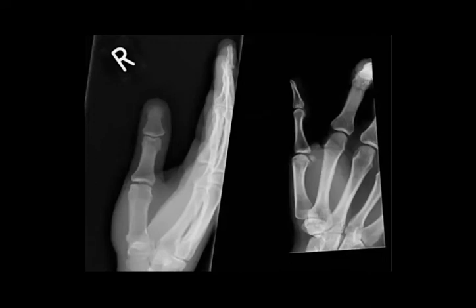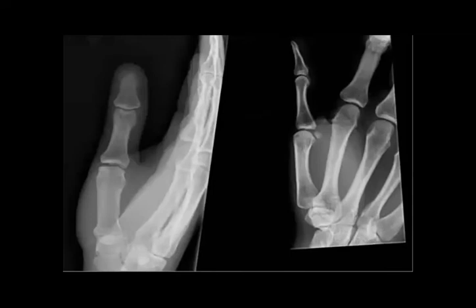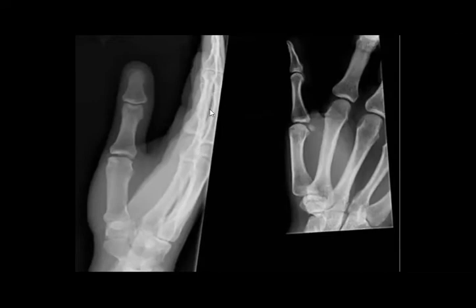I will focus on the pathology, then you are down the hand. So check the joints, the proximal joints, then try to find the abnormality.